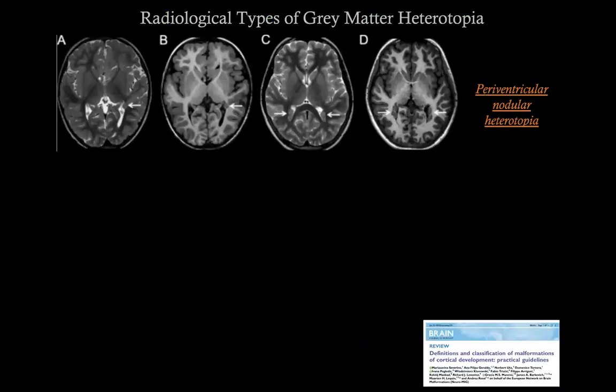This is the typical periventricular nodular heterotopia. Small nodules looking like normal gray matter on images. We know on pathology they are not completely normal. And again, guys, I presented this in the north of Italy in December 2023 at a beautiful congress dedicated to the approach to gray matter heterotopia in children with epilepsy. And this is so complicated. The network they participated in is very, very complicated. So this is the first thing.